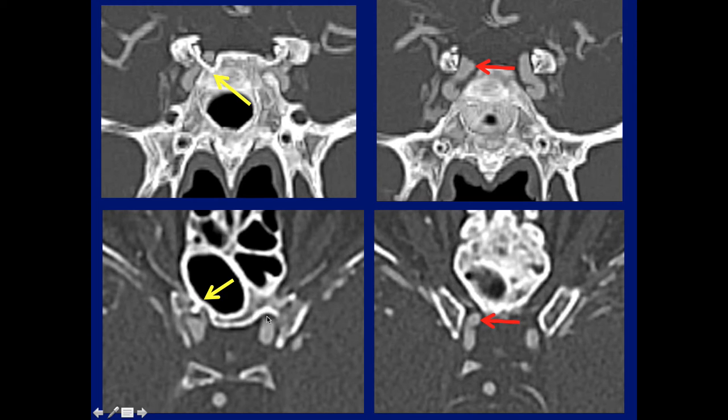And here on the axial plane, this is the level of the optic strut. Here's a little bone of the optic strut, and here's the aneurysm on a slice above it. We can see the ophthalmic artery faintly here. So this aneurysm is really above the cavernous sinus and would be within the subarachnoid space if it bled.